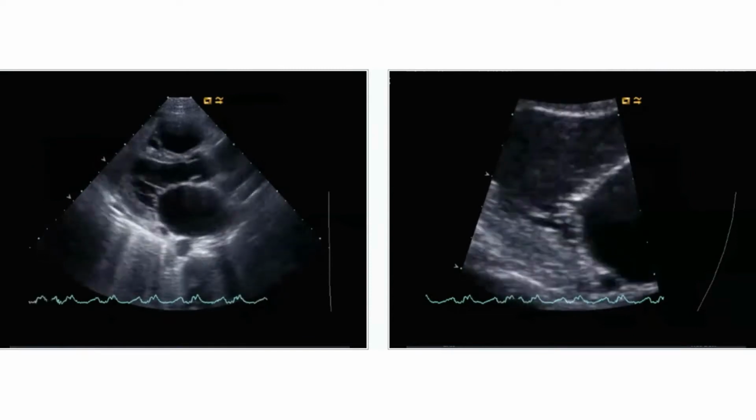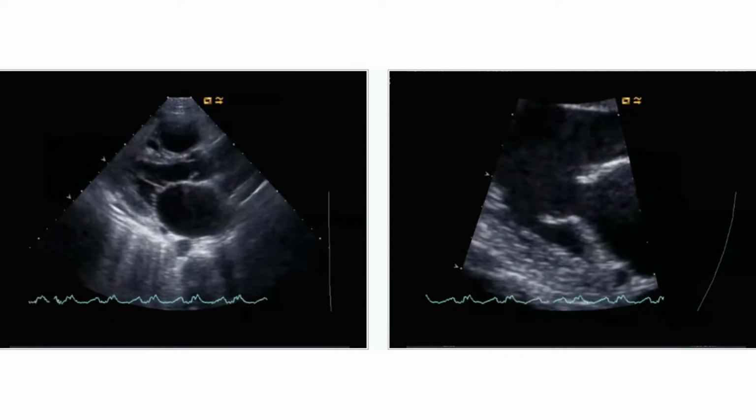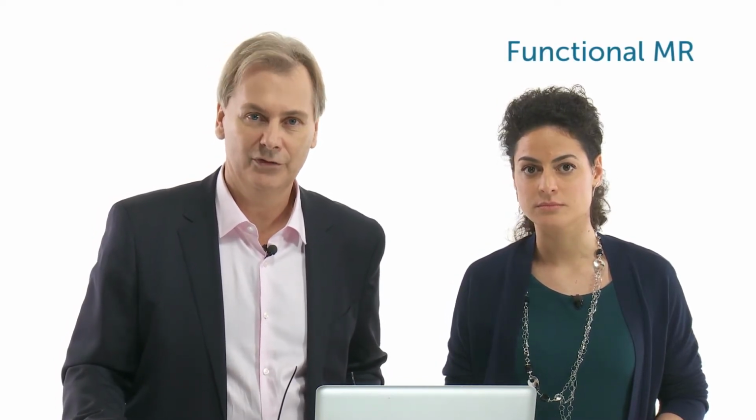This is absolutely true. In many patients, you don't even need color Doppler. We'll talk about color Doppler later, but you don't need color Doppler to determine that there is regurgitation. The interesting factor here is that this is a valve that does not have a structural defect. Still, it's very incompetent. You'll learn later that we call this form of mitral regurgitation functional mitral regurgitation.